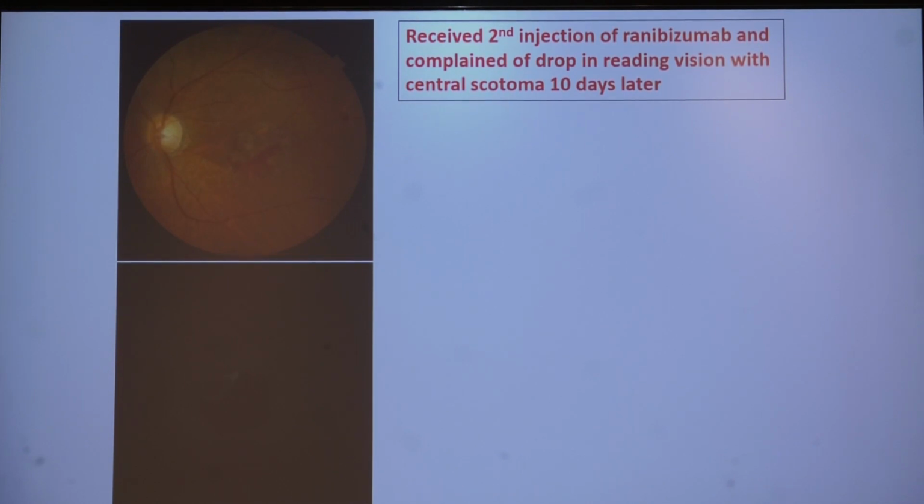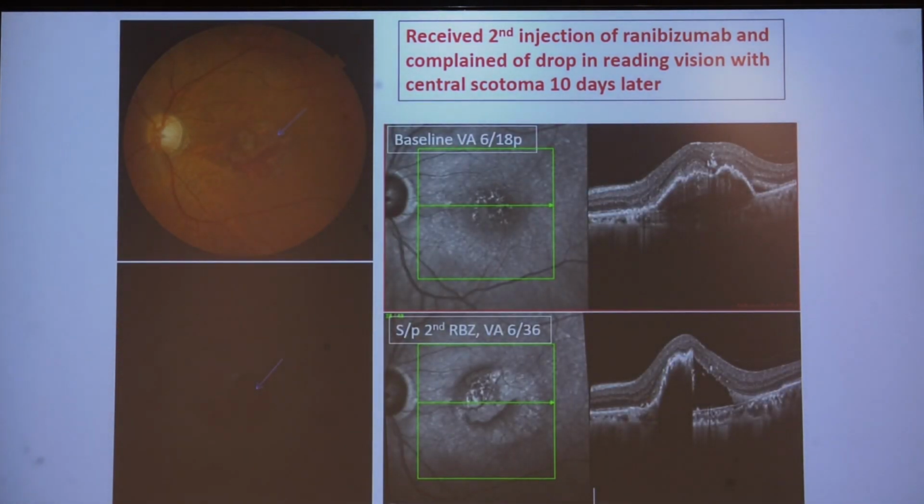And if you remember the checklist that we went through, RPE alterations, RPE tear, RPE loss will also give you that appearance. And you can see that she unfortunately went on to develop an RPE rip, and it's actually folded. You can see that black autofluorescent area, and that's the comparative OCT. So the OCT, the autofluorescence, and the fundus appearance, which is gray, black, and that rip, kind of tells you, that is also something which will appear as gray in the macula.